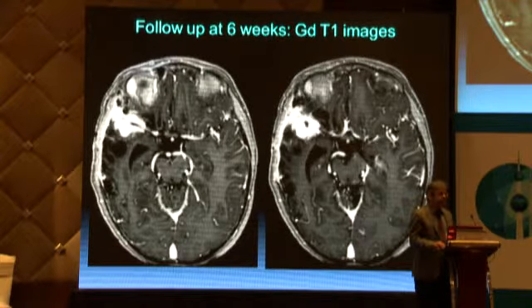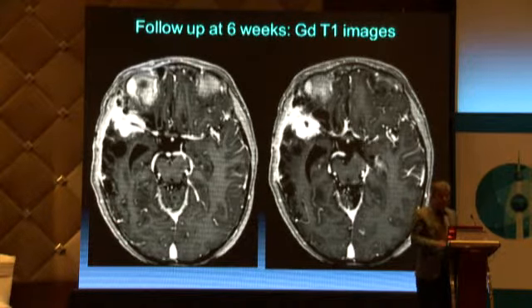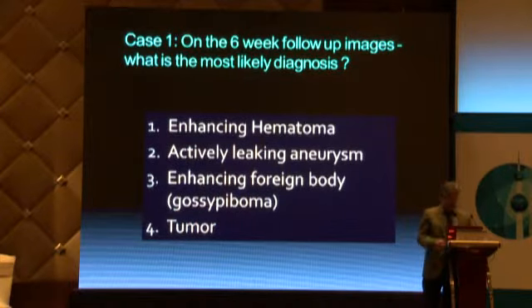So if you look at this, then tell me, on the 6-week follow-up images, what is the most likely diagnosis?